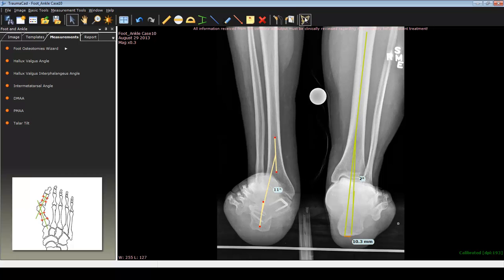How would that work? They would select the defined fragment feature, and they would define the fragment. Well, if you're making your osteotomy here, you could do an opening wedge, closing wedge type of osteotomy, but let's just say they are very fancy and they've decided to do a focal dome osteotomy to correct this, and we won't talk about why that would be a good choice, because that's for another lecture.